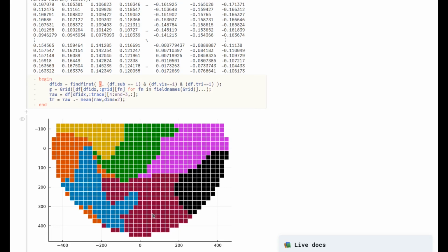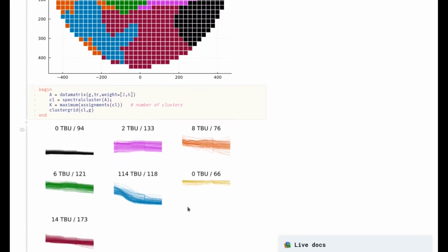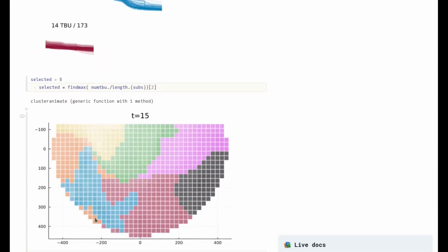In this interactive Pluto notebook, we use the collected time series together with information about the box locations to cluster the boxes. By looking at each time series within a cluster, we can figure out which clusters have the rapid and severe thinning that signify breakup of the tear film. This helps us to locate regions of interest for further study. In other work, we intend to explore intra- and inter-patient clustering as well for clinical insights.